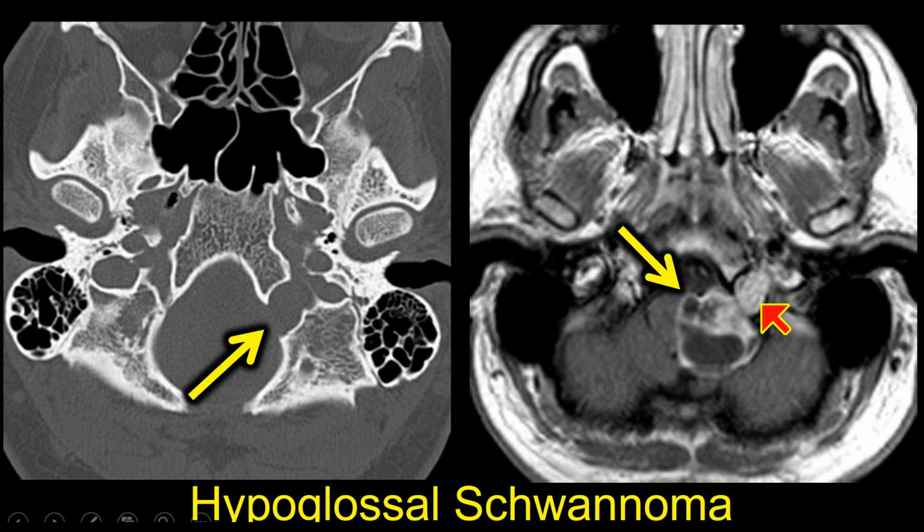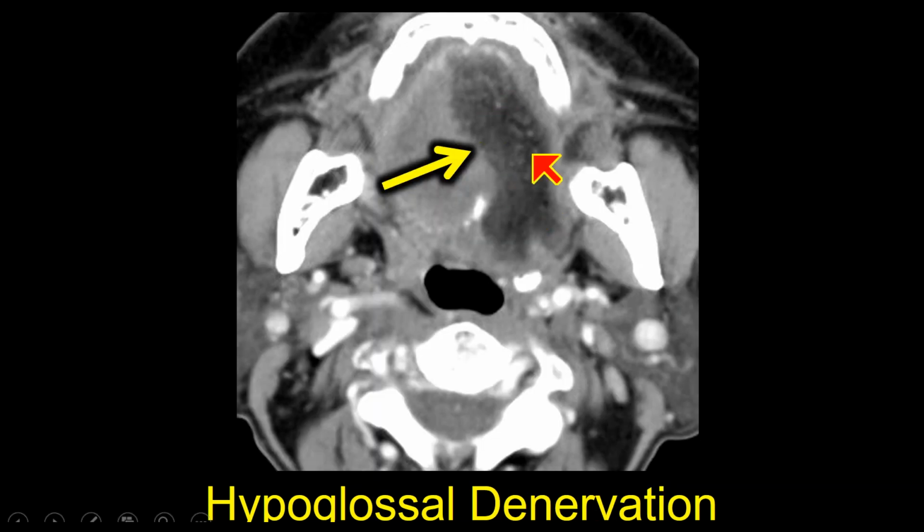Now, if we have a hypoglossal pathology, that goes to the intrinsic and extrinsic muscles of the tongue. So we may see hypoglossal denervation. On a more delayed case, we see fatty changes of the tongue musculature on that side. Every now and then we may see a case like this. We may not know why the 12th nerve is out, but when we look at those images, it may be difficult because it might look like this side has a mass when actually this is normal tongue musculature and this is fatty replaced denervation changes on this side.